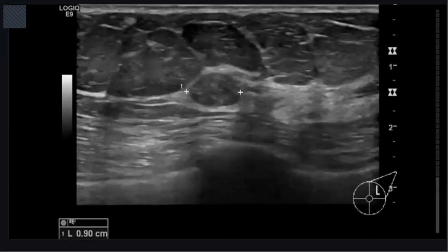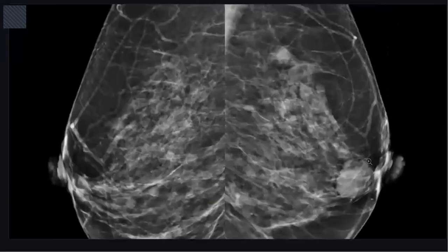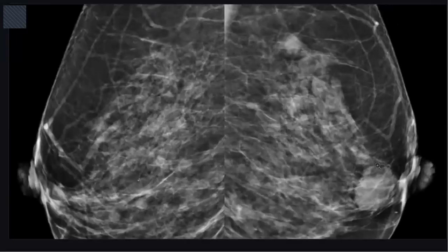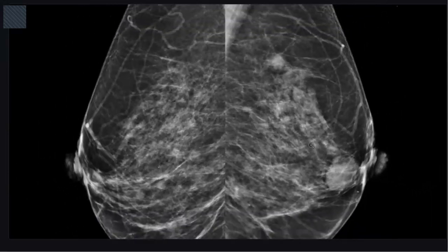This breast case is a gift in the exam. Simple case, but don't go deeper into a finding you couldn't see well. Okay, this is a well-defined macrolobulated retroareolar soft tissue density, without any skin retraction, skin thickening, internal calcifications, or parenchymal or architectural distortion. So it is likely to be a benign lesion. We can give it an initial score of M3.